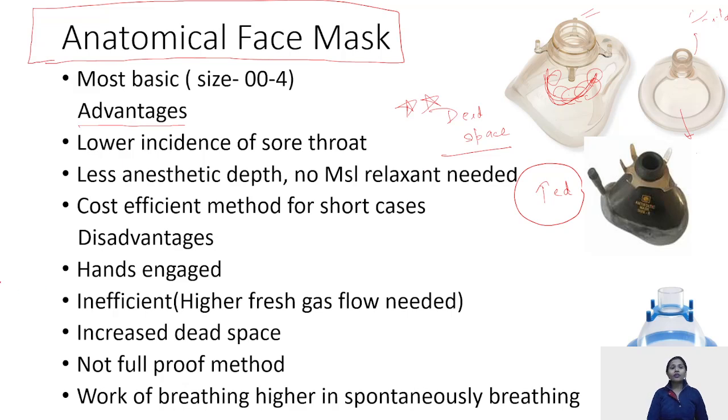The disadvantages of these masks are, if you can see, your hands are engaged when you are holding this mask. Of course, this is an inefficient way. It is just to buy time in the form of pre-oxygenation during general anesthesia, or till your definitive airway has been secured. The dead space increases. It's not a foolproof method. It does not prevent aspiration. Rather, it can lead to an increase in the work of breathing, especially in a spontaneously breathing patient.